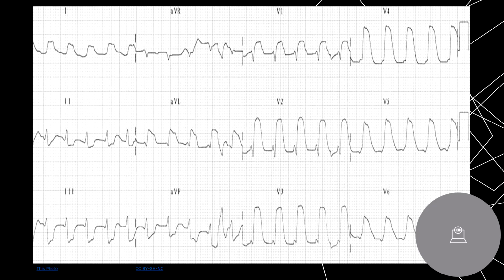All right, so check this out. Let's go to, we got V1 right here. Yep, V1. We got V2, so let's look at that. Man, this is actually a pretty neat complex because if you look at this rhythm, it looks like VTAC. If I saw this going across my screen at over 100 beats a minute, probably more than 100, 160, 170, I'd be like, this is VTAC. But let's break it apart, right? So QRS, T wave, QRS, T wave.